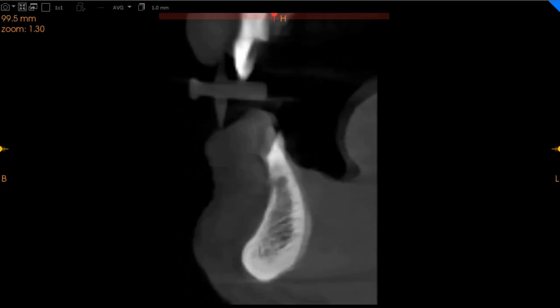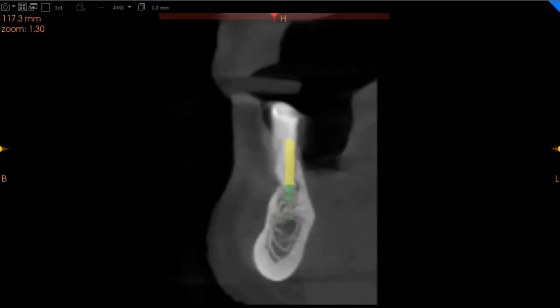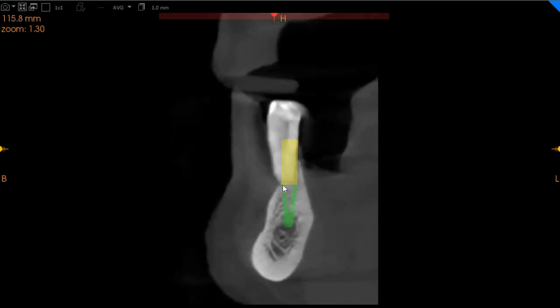Moving to the lower left side, this is the implant which is between canine and first premolar. Here we've got approximately 6 millimeters of ridge width with approximately 11 millimeters of ridge height. And here you'll have to place the implant much deeper, approximately 4 millimeters deeper, to get good adequate bone, 5 millimeters of width with 10 millimeters of height.